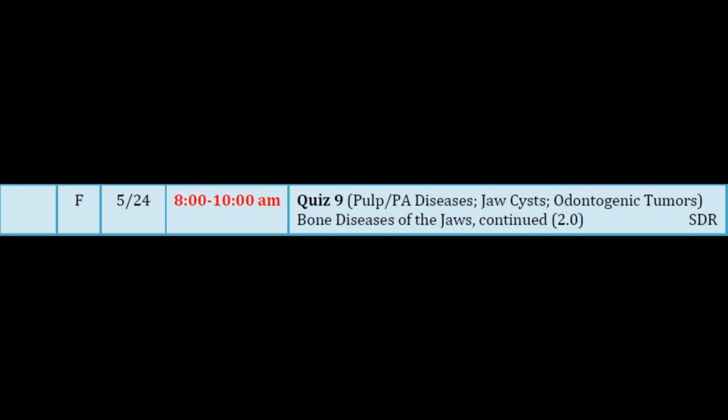Radiographically, because this is a neoplasm that slowly enlarges and has a capsule, it presents as a well-defined round to oval lesion that is lucent to mixed depending on how mature it is. So they tend to start out lucent and then they become mixed over time. And when they are in the pure lucent stage, there is nothing about them that says, hey, I'm an ossifying fibroma, so we don't even put it on our differential diagnosis for purely lucent lesions. We only consider it in the differential diagnosis for a lesion that's mixed.